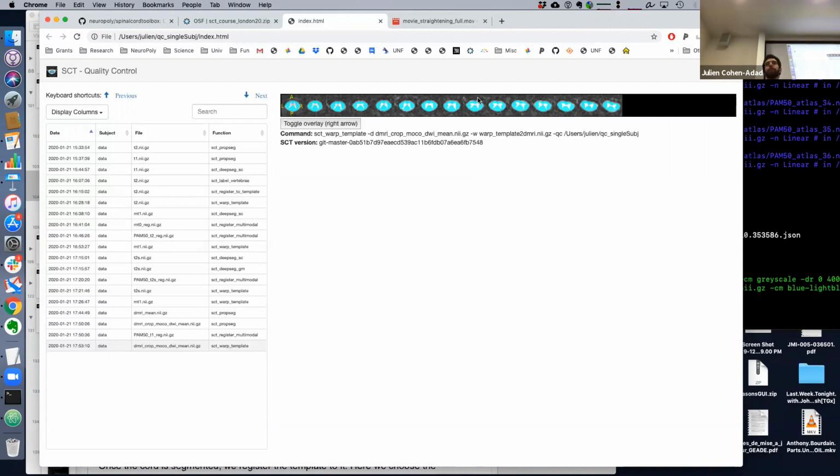The non-linear registration is doing as best as it can, but you can never take account of those slight distortions across the edge box. So you always have those, and they're not taken care of. So you'll receive an email from me, and we can work together on how to tweak this registration step.